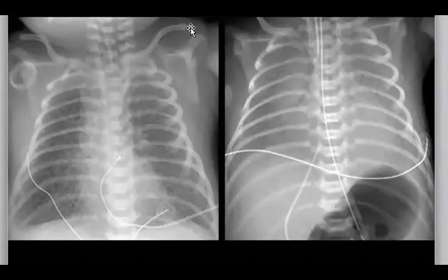So try to find, is it preterm or full term? Yes. The differential will be surfactant deficiency disease or not. So bilateral, yeah. I think it will be group B, perfect. So group B streptococcal pneumonia.